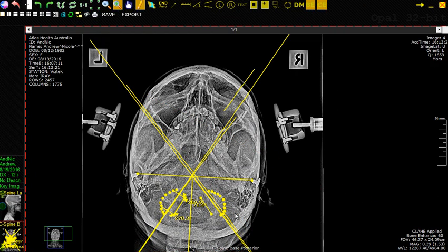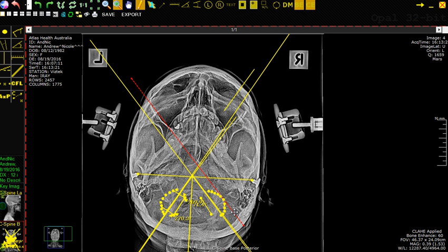Right there. Now what I'm going to do is drag it so that it overlaps with that most lateral aspect here, so it corresponds with the edge. Now I'm going to drag it up so that it's just intersecting. And again, I'm trying to eyeball it approximately here. That looks about parallel. So you can see here that this line is not the same as this line.